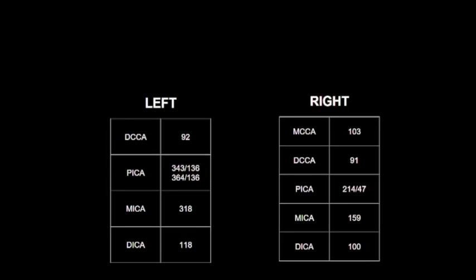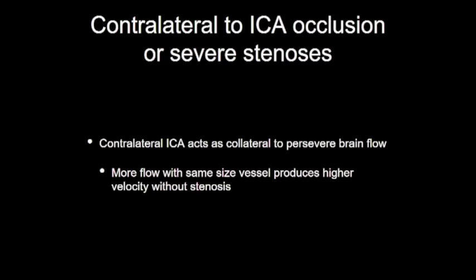All right? So what do people want to call the right side? How many people want to call it normal? How many people want to call it above 70%? How many people want to call it 50 to 69%? How many people want to call it less than 50%? Really? Jeepers, this is a really smart group.